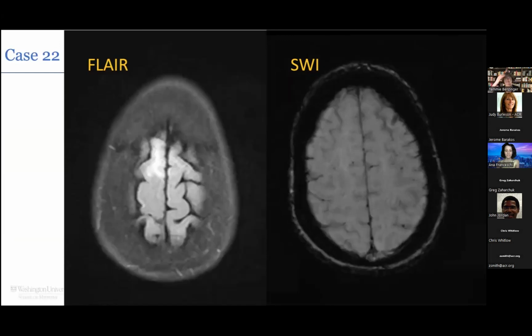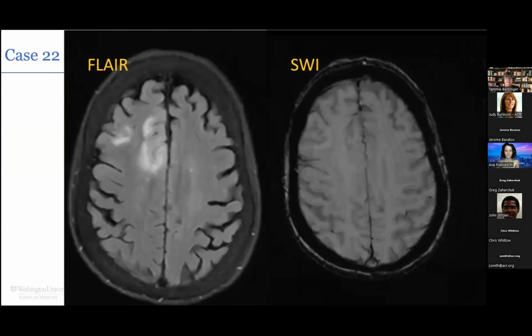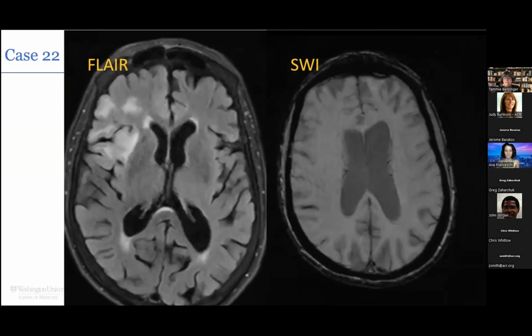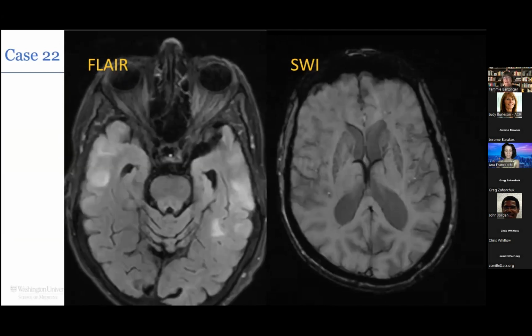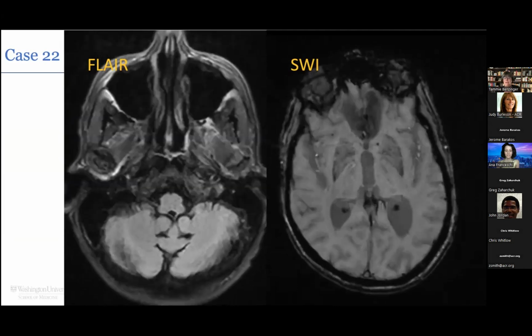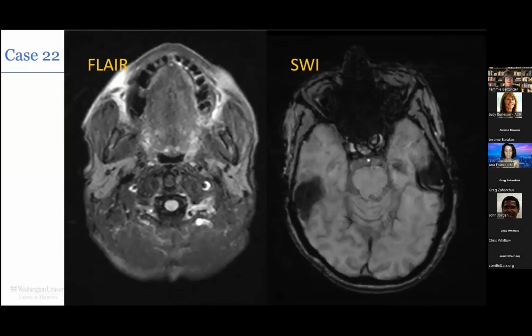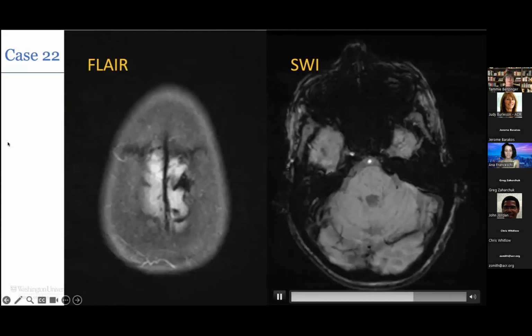just so you can start to get a sense of the widespread areas of the vasogenic edema, as well as the multifocal microhemorrhages. And, incredible to think about finding this dramatic still being asymptomatic. And you can see how subtle those microhemorrhages are, but you can see them kind of pop in and out as they go by. Okay.